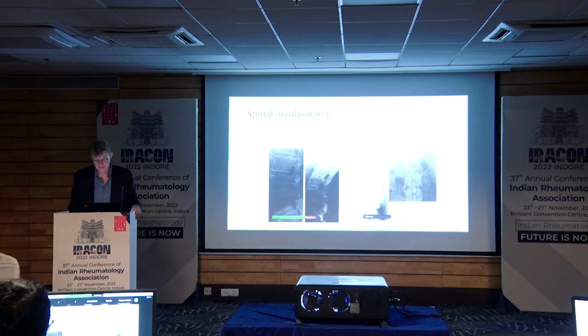The spine where you have the vertebral bodies here and here. But then there's also a bridge here, that's the syndesmophyte, which bridges with the next syndesmophyte, and thereby it looks like a bamboo spine. Typically in ankylosing spondylitis, that is, you can say, symmetrical, and quite a lot of them on both sides and several vertebrae.